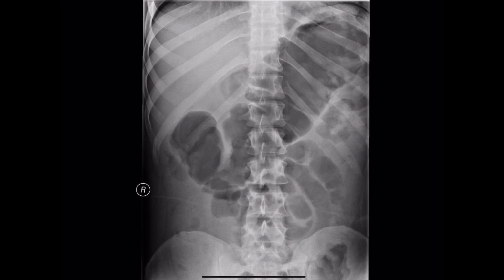But this is so important when I go on a ward round and find somebody with perhaps inflammatory bowel disease or terrible C. diff colitis, and I'm concerned because their abdomen is distended, they have a temperature, their white cell count is going up, and I get a plain film of the abdomen, and you give me lots of information. Could you take me through this plain film?